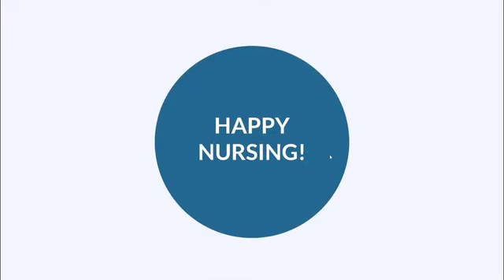Make sure that you check out all the other resources that are attached to this lesson. Make sure when you look at the EKGs that you calculate them, that you look at the boxes, and that you multiply them so that you're getting 0.20 seconds.